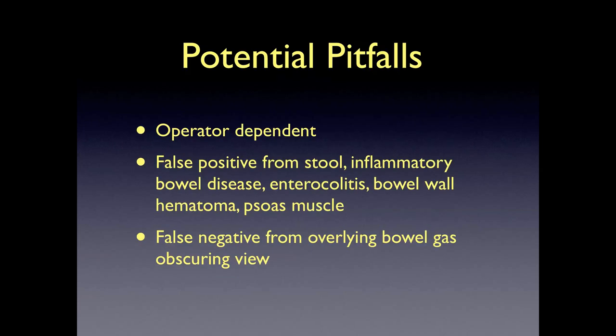Next, we're going to talk about the potential pitfalls of using ultrasound to diagnose pediatric intussusception at the bedside. Because ultrasound by its nature is operator dependent, false positives and false negatives tend to be higher in the hands of an inexperienced operator.